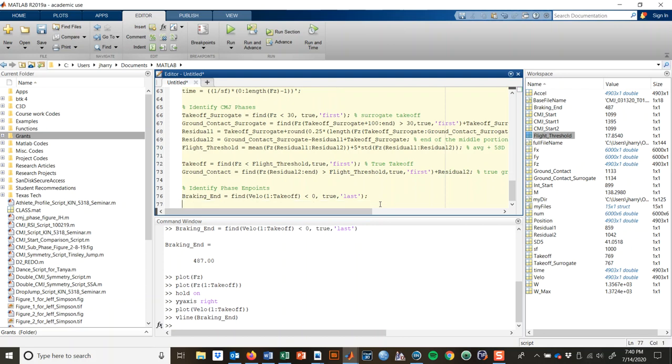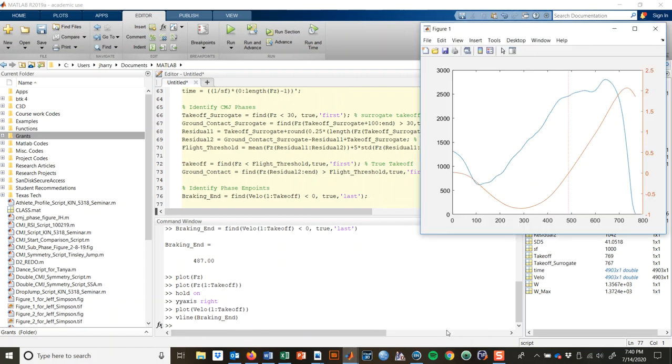The next one we'll find is the end of the unloading phase. Now we define the unloading phase a little differently than some others. Some others call it an unweighting phase, just semantics for the term. But for the time period of the phase, we use the time from start till the local minimum ground reaction force here, because that is actually an unloading of the body weight ground reaction force. Anytime after this, the force is increasing, so there's actually a reloading happening. So if you keep the nomenclature, and you say unloading or unweighting, you can include periods where you are re-weighting.